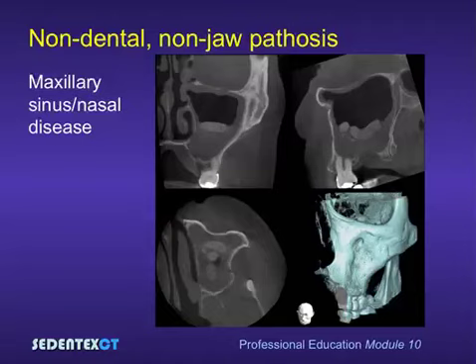Of course, there is a close interface between dental and maxillary sinus disease, and here is a case where there is a complete conjunction of the two. When you look within the sinus here, we can certainly see mucosal thickening, but we can also see the presence of 3 very well-defined radiopacities, and these were roots of a tooth displaced into the maxillary sinus during extraction. You should also be able to appreciate on the sagittal scan on the top right the defect in the maxillary sinus floor as a result of the displacement of the roots.